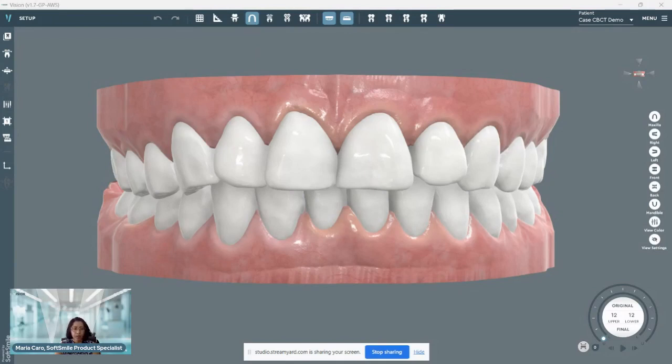One of the things that we'll go over is the real and parametrical roots that you have the option to use, and we'll discuss that when we get to that moment.